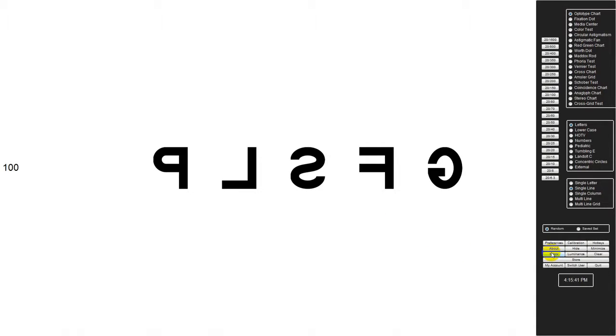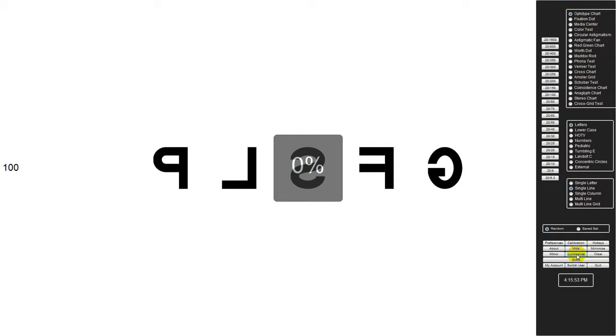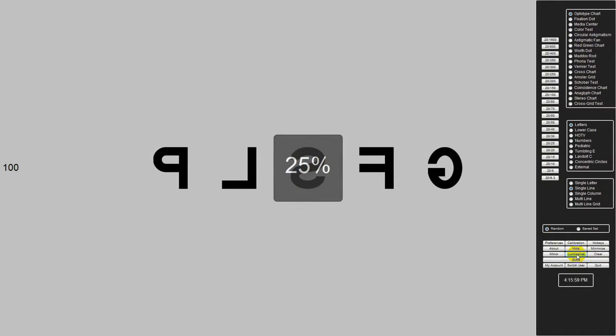Mirror, if you're using a mirrored system, that's how we set that. Luminance is also different variances of brightness you can have. You can set it, and I'll show you that in the preferences setting. This is set up for 0. In other words, no full brightness, 15% less brightness, 25% less brightness, 40% less brightness.